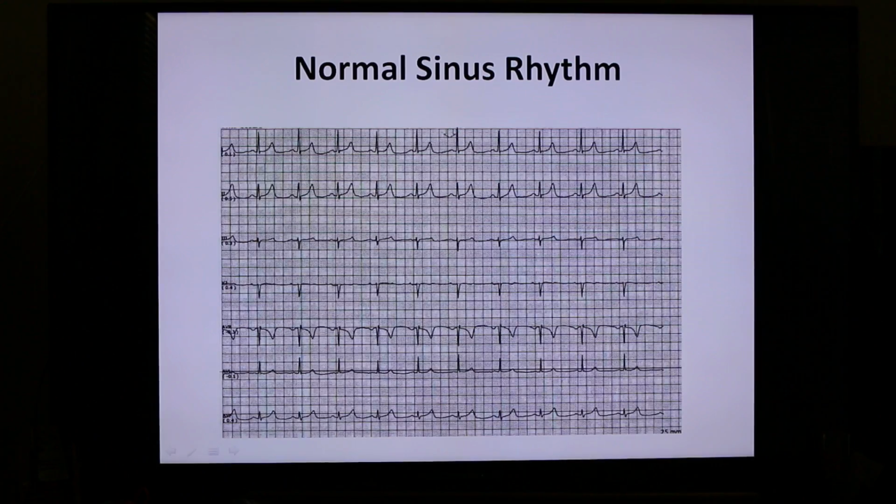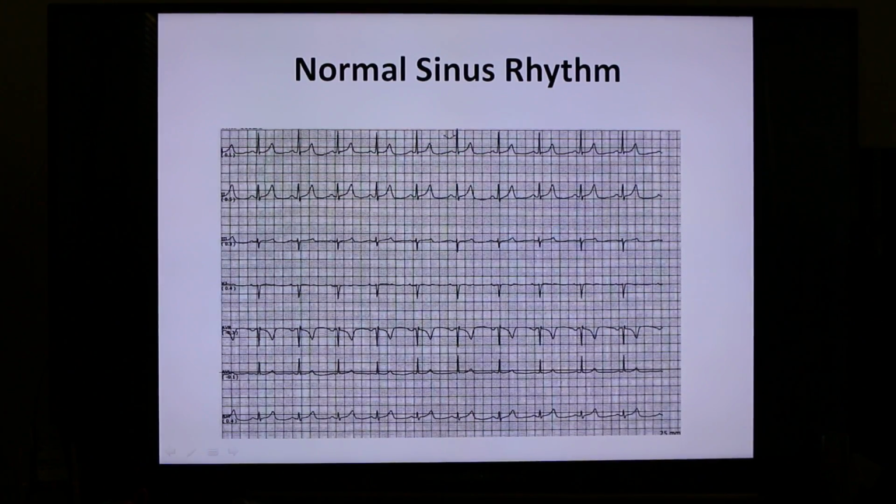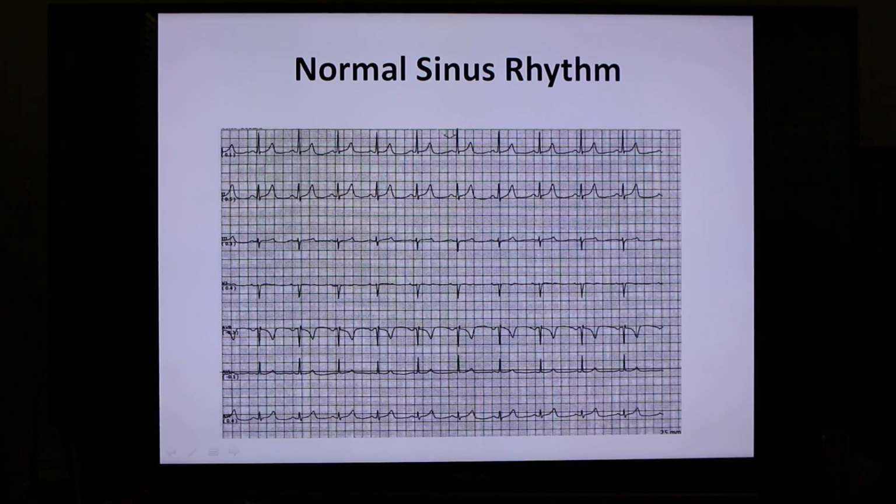This is a full disclosure of the patient in telemetry. It shows all limb leads 1, 2, 3, AVR, AVL, AVF, and the V lead. The P wave has a sinus node morphology, being upright in 1, 2, and AVF, and inverted in AVR. In EKG rhythm tests, the leads commonly shown will be lead 2 and also V1.